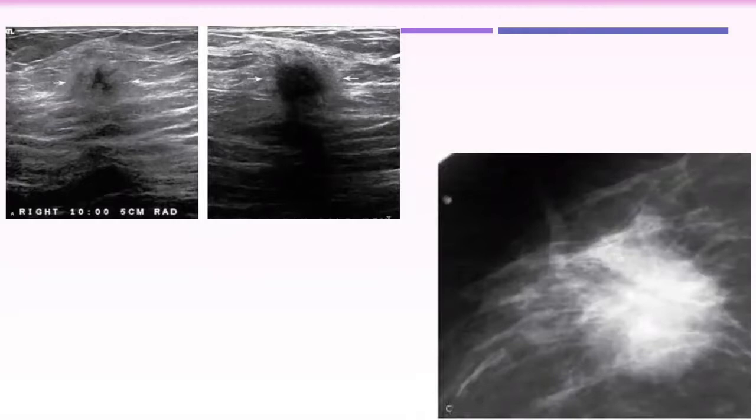So how do you characterize the lesion on ultrasound? On mammography it is highly suspicious, but the ultrasound follow-up signifies that this lesion is downgraded. On mammography, I give it BI-RADS 4B, or 4C, sorry, or 5. Yes, it is almost 5. But on ultrasound follow-up, it was suspicious, but the patient might disappear for any reason.